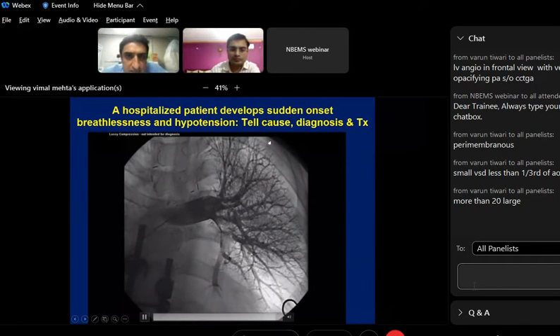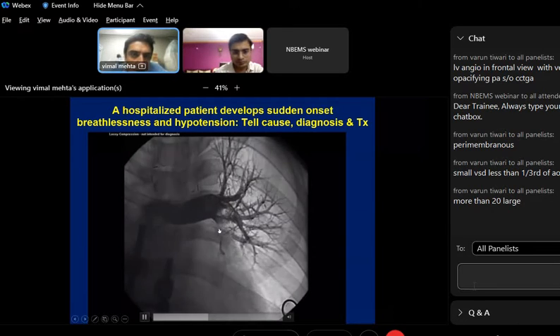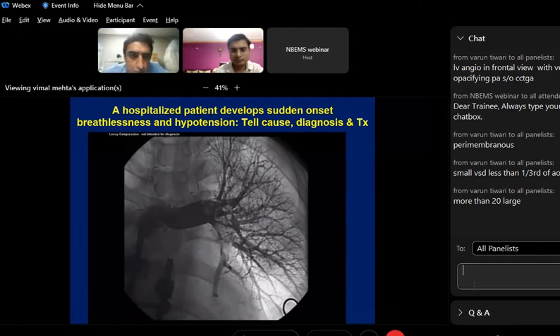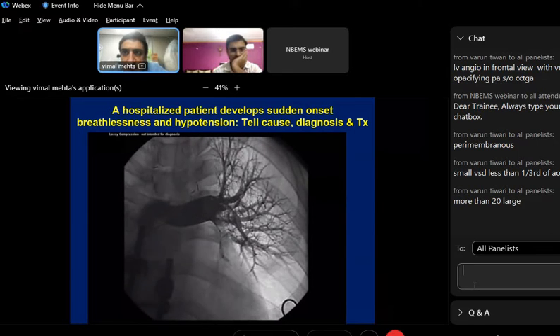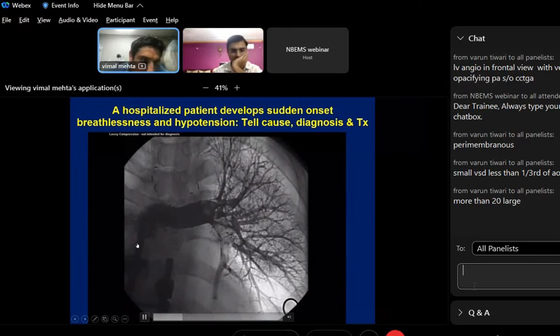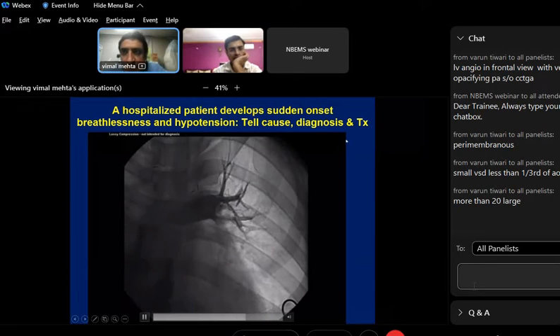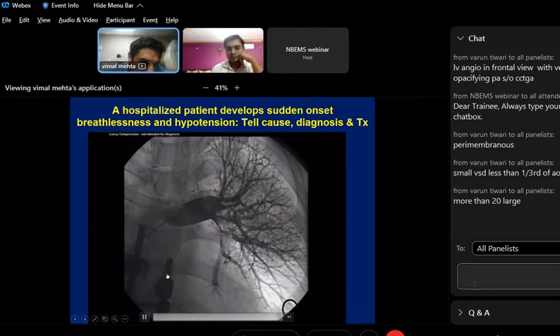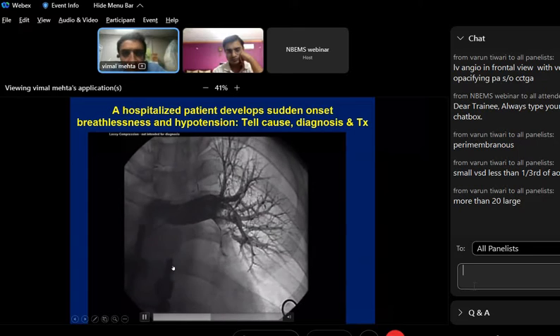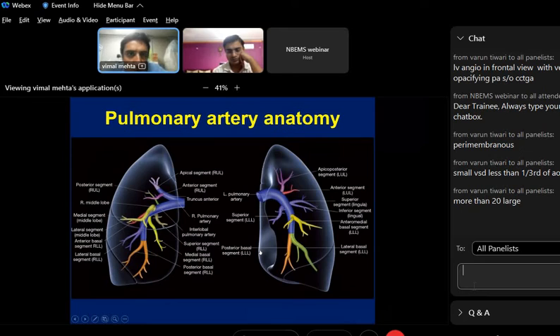Can you see something else in the whole picture, post surgery? Which surgery? Undergone surgery. Which surgery? Ortho surgery. Why? Okay. This is very good because somebody has nicely picked up these rods which have been put to stabilize the spine. This is not CABG. This is likely, as rightly said, a spinal surgery. That's what one can say, and after that the patient is obviously immobilized.